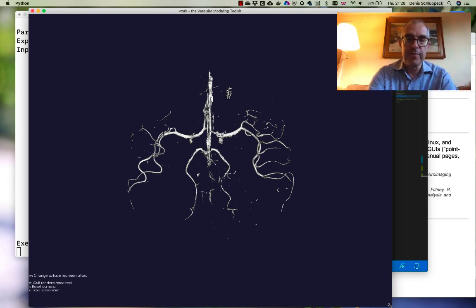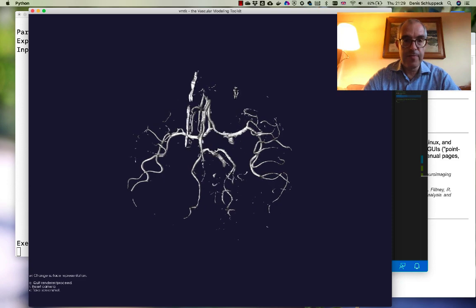If you don't know exactly what that means, think about the difference between a 2D photograph, which is represented on the computer as a bunch of pixels with intensities, and a vector graphics file like a PDF, where lines are represented as geometric objects. They are very different ways of representing the data. We can talk a little bit more about this in a while. So this algorithm went through this very big image in 3D and reconstructed the surface representation of what's present here.